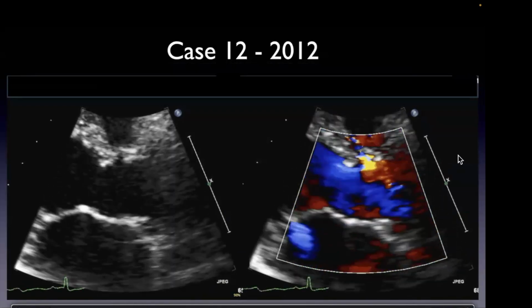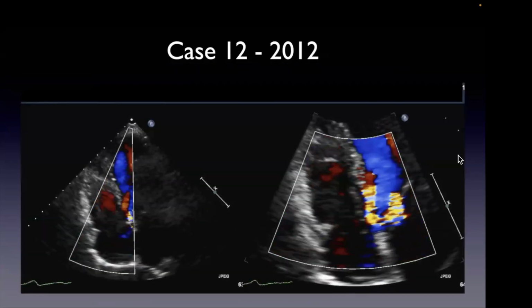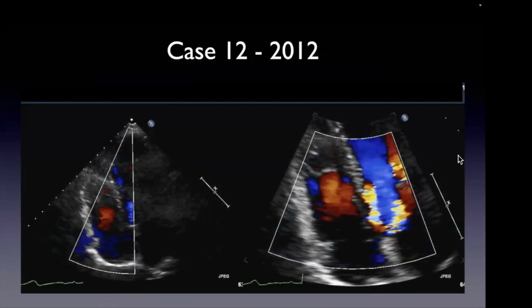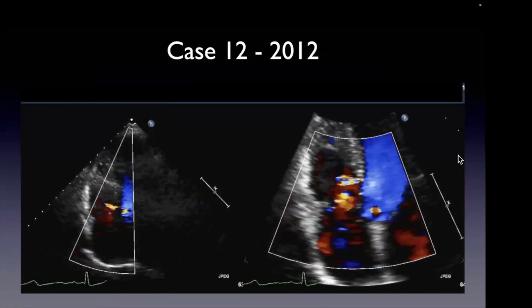And then of course the other view is one of the apical views. You see the timing is mostly systolic, there's a little bit of diastolic flow, but it's systolic, high velocity between the LV and the RV, so pretty typical restrictive membranous VSD flow. And in the apical views, if you can get it, you can see here it's on the ventricular side, right?